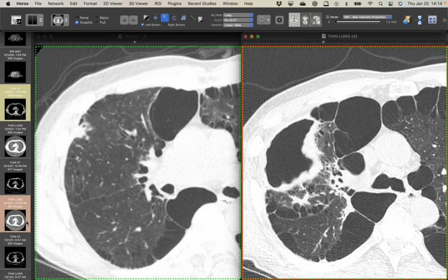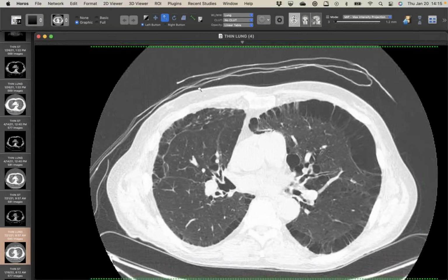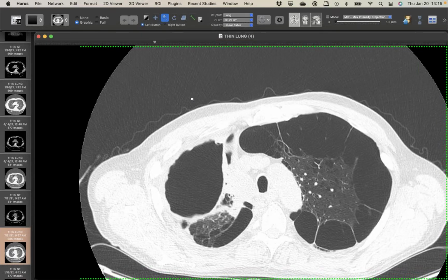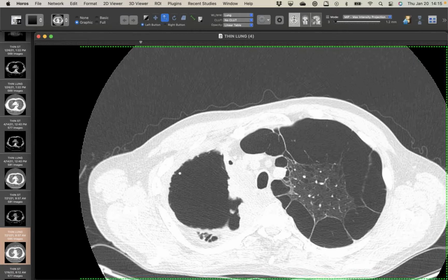So we kind of watched it for a while. They did another CT scan 3 months after the one I just showed. I'll blow it up to show that. And what's happening with this cavity is we're starting to see more of this kind of wall abnormality, very fine.